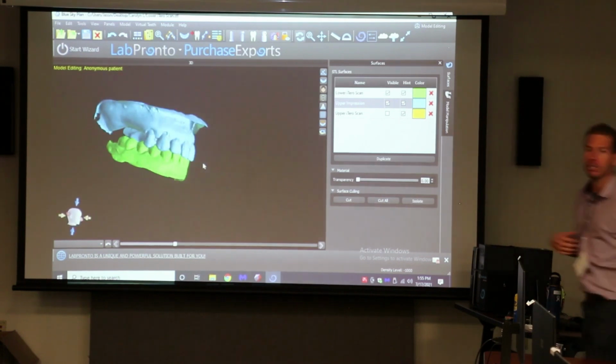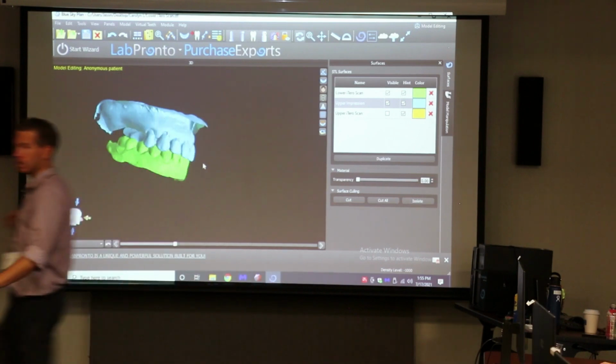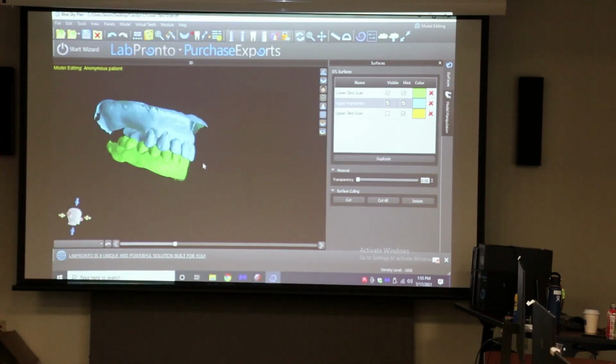Does everyone have the blue stitched to the green? No. Okay. Coming around. Okay, sweet. So that's correct. So you want to tell the green to align to a model, to the blue, yep. And then for this one you want to select align using points. Okay. So now you're going to rotate both of these and find common views. So get your orientation of where you're at here.